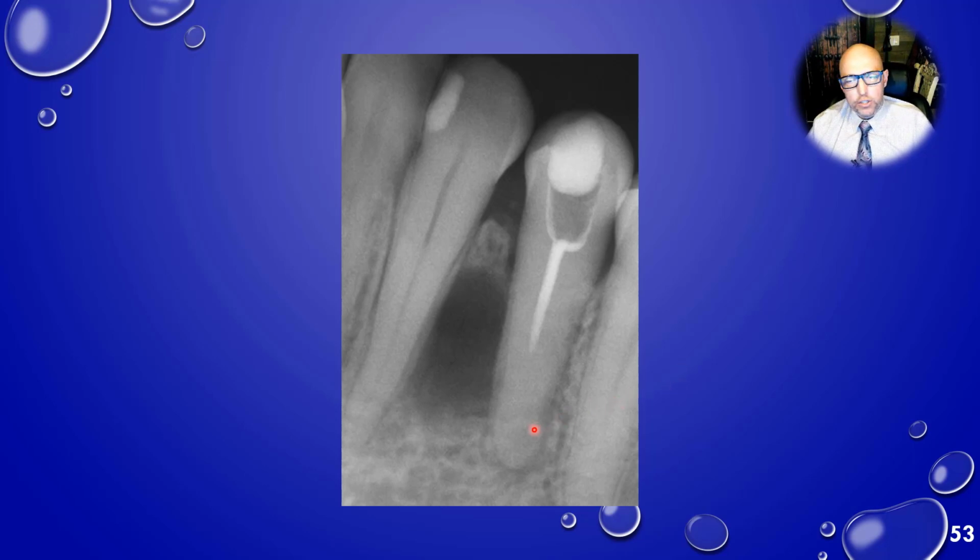Okay, so there's something I mentioned a little bit, but I didn't really focus on lateral periodontal cyst in this lecture. I talk about that in my location-specific lecture because those have a very specific location. This one happens to be that location, which is right on the lateral surface of a tooth, particularly mandibular premolars. And so you might see this and see it's somewhat well defined. I don't see corticated, so I wouldn't describe this as corticated. But it doesn't look like a blending or irregular border like a malignancy would be. This looks more well defined, even if you have to kind of imagine more of a fat crayon to draw a distinct line around it. I would stick with well defined.